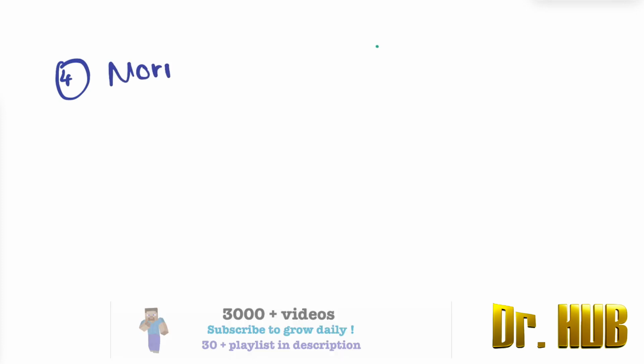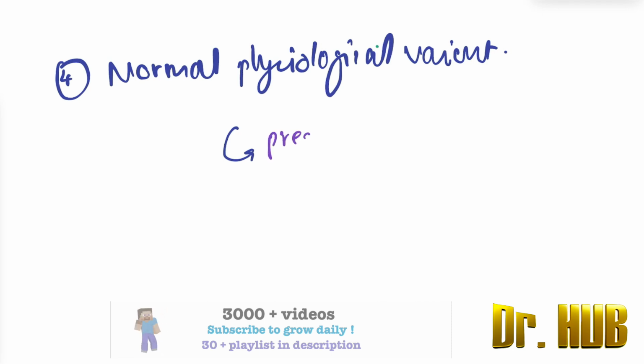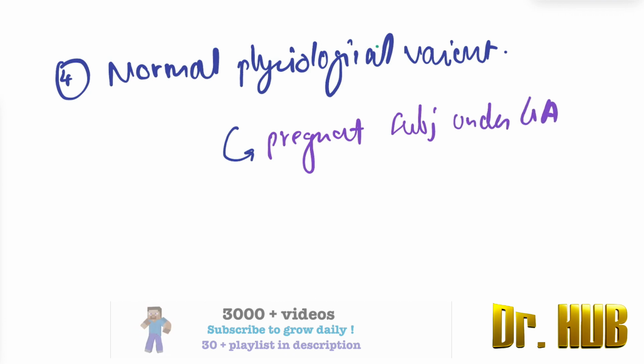Then we move on to the normal physiological variant, and this is seen in a pregnant subject under general anesthesia.